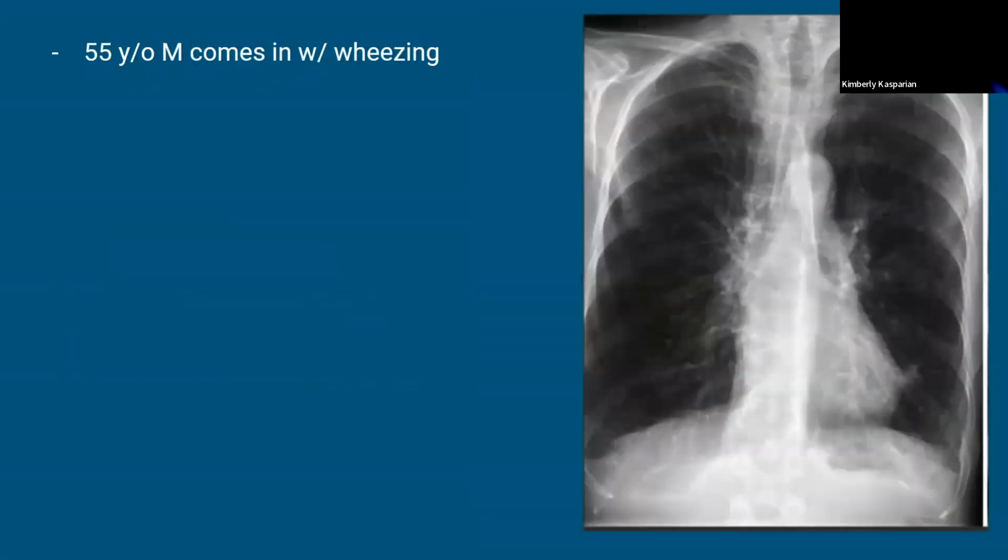Okay, I think that's all the pearls on effusions. Okay, we see this all the time. A 55-year-old guy comes in wheezing. He looks like he smokes 37,000 pack years. He probably does have COPD. How would you describe this chest x-ray?